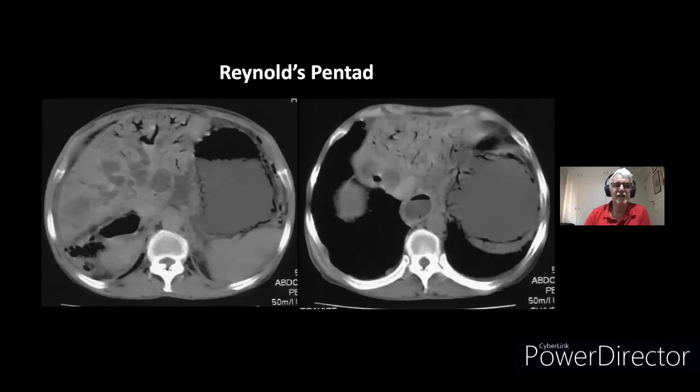And I hope none of you ever see 2 X-rays like this, because she's got a full house. She's got air in the biliary tract. She's got hepatic abscesses. She's got air in the IVC and in the portal vein. And she's developed necrotizing gastroenteritis. So there's free air in the wall. I'm not quite sure how she managed to get to the CT scan, but she did. But that was the last event in her very sad clinical course.